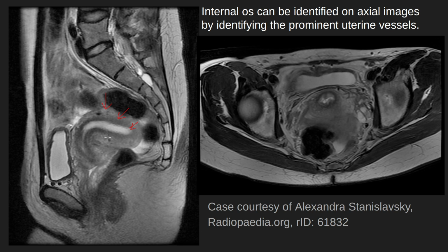It is important to understand where the cervix ends and where the uterus begins, because in terms of identifying patient candidates eligible for fertility sparing surgery, we need to identify the tumor extension, and the tumor should be greater than 1 centimeter from the junction of the cervix and the uterus. So accurate assessment of the cervico-uterine junction is important.